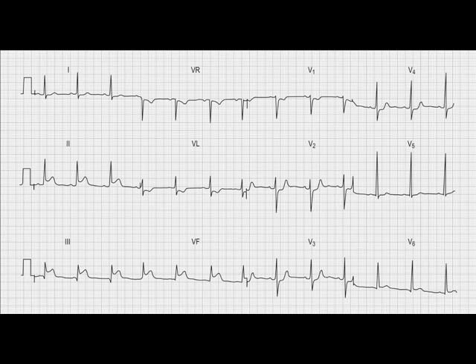You must see 25 millimeters per second printed on the 12 lead. You don't here, it's a textbook example, but you must in clinical practice. And the box calibration on the far left for the height of the complexes does equate to 2 large squares high.